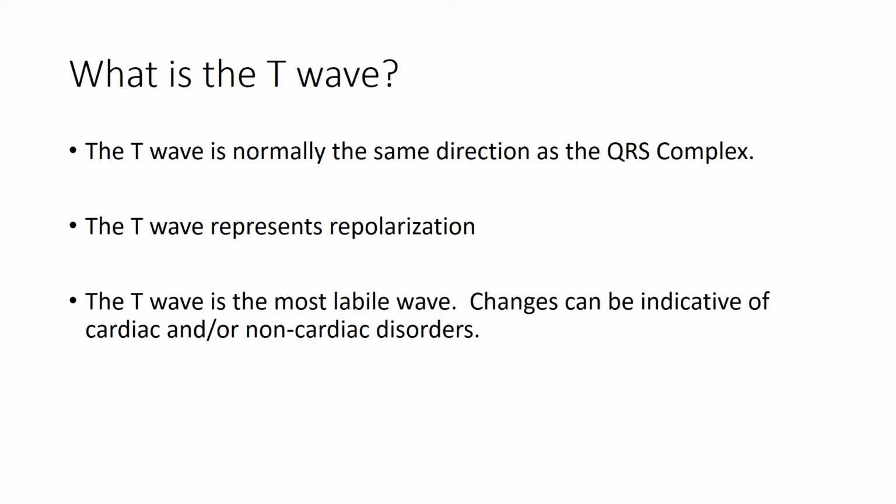The T wave is our most labile waveform, and its changes can be indicative of cardiac and non-cardiac disorders, which we will learn in the next chapter.